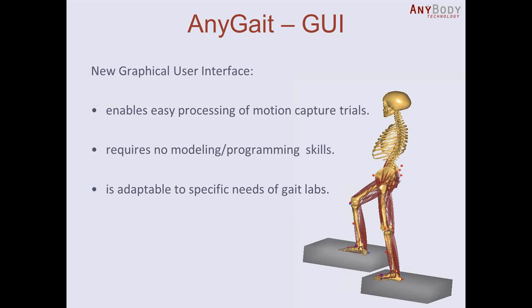We have introduced a new graphical user interface to enable easy processing of motion capture trials, and therefore there is no need for modeling or programming skills of the user. Once again, it's a predefined model, however it's still adaptable to your specific needs. So you can change even this graphical user interface.